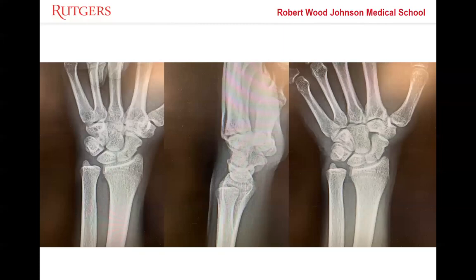So let's start with an examination of these x-rays. And Jason, I see you're right in front of me. So do you want to take this one and tell me what we're looking at? Let me stop you for 1 sec. This is a PA. So you're shooting from posterior to anterior. And then the third view is more of a scaphoid view, which is a PA with ulnar deviation.